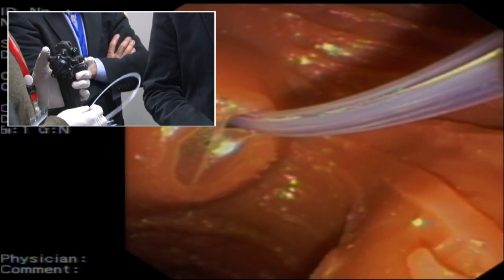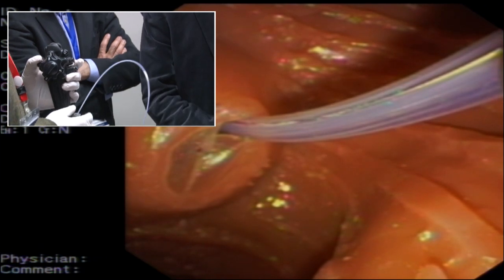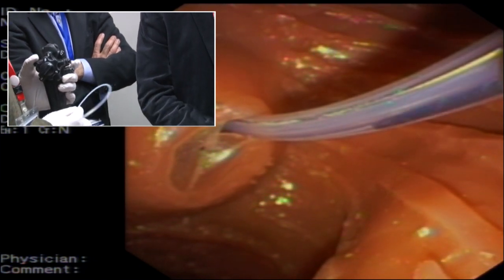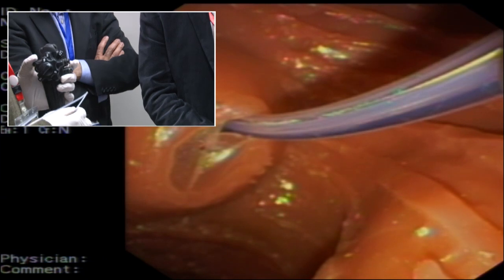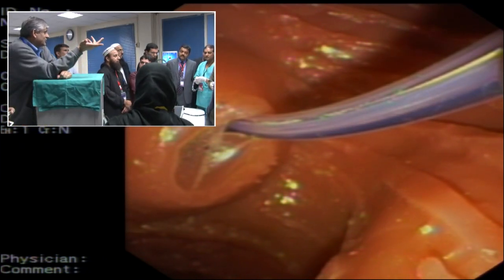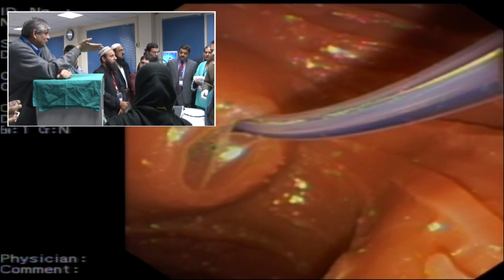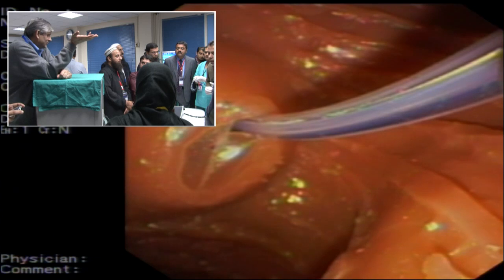On the dummy, what you need to do, each one of you, you need to understand the role of big wheel, small wheel, shoulder movement, and pull and push. These are the movements that we have. There is nothing else you can do. If you understand these 4 movements, that's all you can do with the scope. There is nothing else you can do.